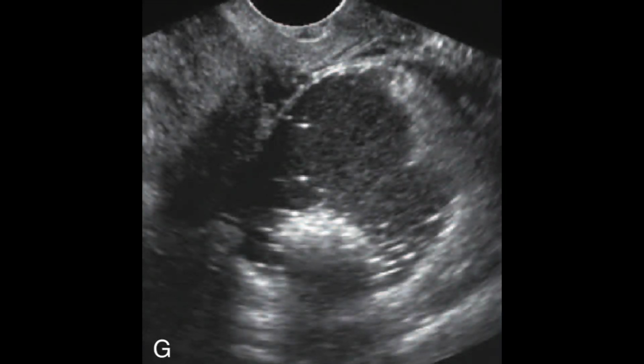As I mentioned, cystic teratoma has a variety of appearances, and you should have a look for all these identifications and appearances, not forgetting that this is an important lesion. Although it's benign, it still needs attention because of its management.